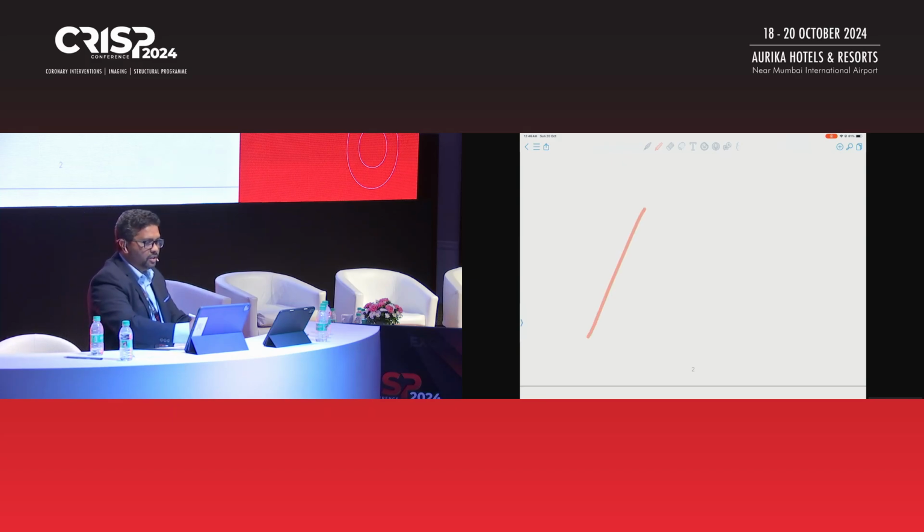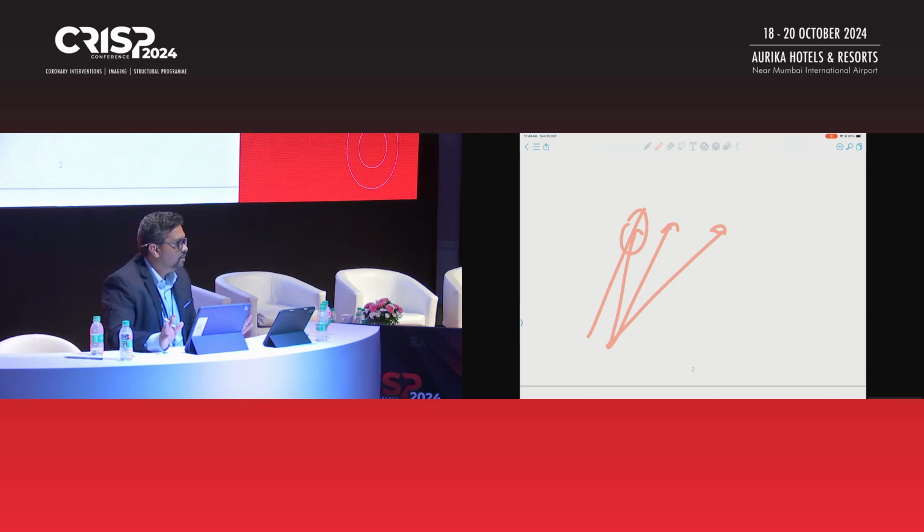On the other side, see, if this is the annulus, in RAO caudal I don't know how it is oriented, I just open it. In LAO cranial, if it is like this, versus like this, versus like this. If it is this, I'll resheath it. If it is like this, I am happy actually, but I want to be cautious that it does not tilt out. So I pull out the wire and deploy the rest of the device. If it is like this, I push the wire. So if you're pushing here, it comes like this.